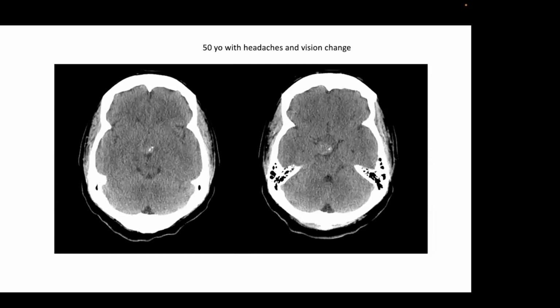Now, here's a patient with headaches and vision change. You see a few flecks of calcification here. Again, the patient's 50 years old.